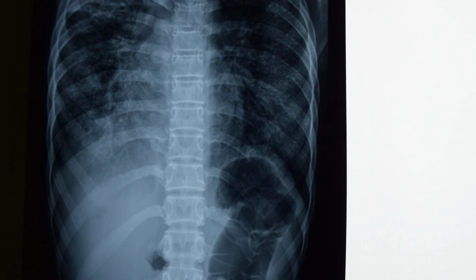Primary lung cancer with hematogenous spread may also cause similar miliary shadows. So this is a very important chest X-ray with a wide range of differential diagnosis. There are also other reasons which cause non-cardiogenic pulmonary edema, for example chemical pneumonitis. It can be sarcoidosis even.